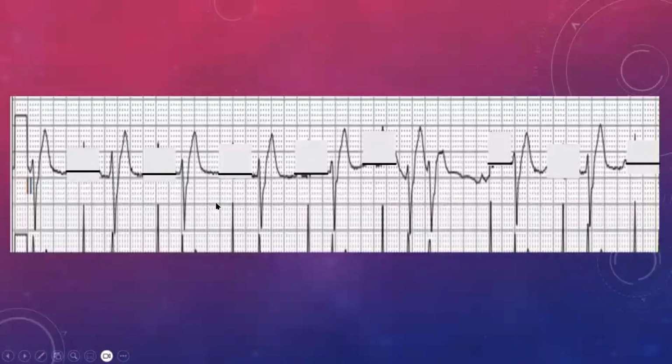So even if you're not sure of the answer, what do you think the heart is trying to do by producing these? Because the ventricle is basically beating on its own in a patient who's got an infarct and who's got muscular damage. He's probably got lower BPs now, and he's starting to become bradycardic. Now, if you're not sure of the answer, that's fine, because you've already got enough to be able to call somebody and tell them, this is what I've got, but there are parts of the ECG I don't understand.